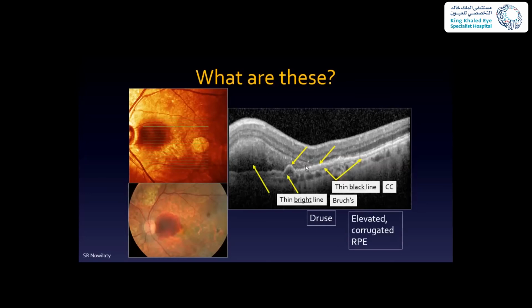And what you see here is an elevation of the retina. So the RPE is intact, but the retina itself is elevated. If you follow the ellipsoid zone, it goes up, up, up, and then comes down. Basically you've got hyperreflective subretinal fluid, which in this case is blood. The shadowing of blood in general is very gradual. Notice how hyperreflective it is here, and then it fans down. Yeah, there is a thin choroid. Exactly. The reason it's a thin choroid is because this patient had, I think, AMD or possibly age-related choroidal atrophy. You're right.